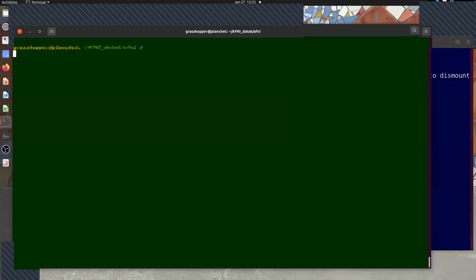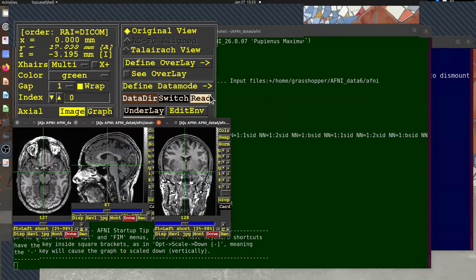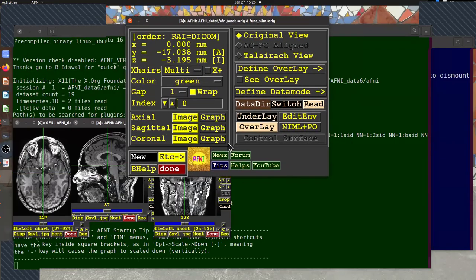All right. I'll also mention here something else. When AFNI itself starts, you'll notice there's a brief image that shows up in a picture, and that, along with things like the startup tip, that picture that goes by so quickly nowadays, it's called the startup image, or a face image, and those are all images that users have provided. And so the idea was, when AFNI first started and things were slower to load, that gave you something to kind of look at or tell you that it was working.